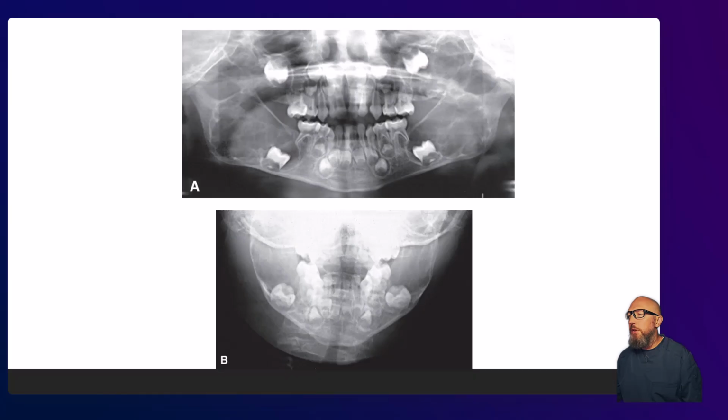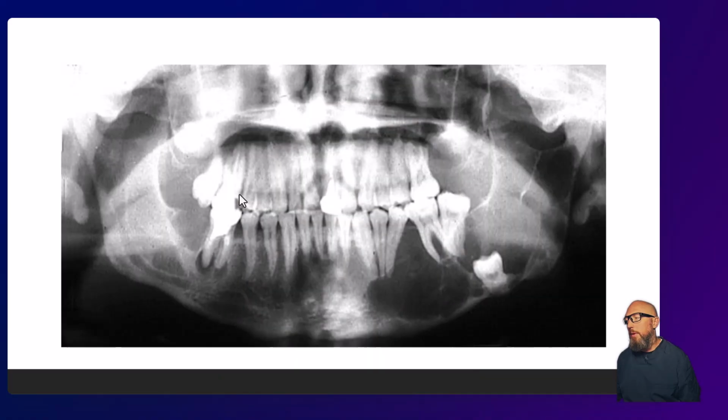Having said that and shown you examples, this looks like the same example I showed you at first, but multiple bilateral, posterior, well-defined, corticated tumors pushing the teeth anteriorly. This is your classic cherubism. What about this one? Is this cherubism? Well, there's one tooth kind of being pushed down, maybe this one a little bit anteriorly, but then you have lesions arising here between the first molar and premolar. Multiple cases, not quite as symmetric.